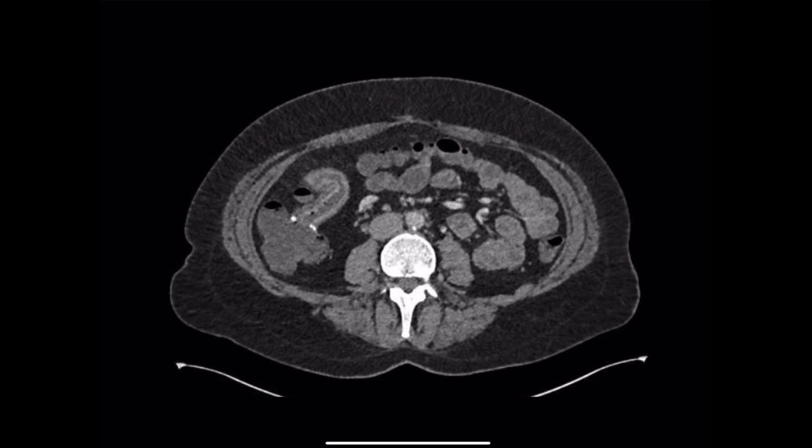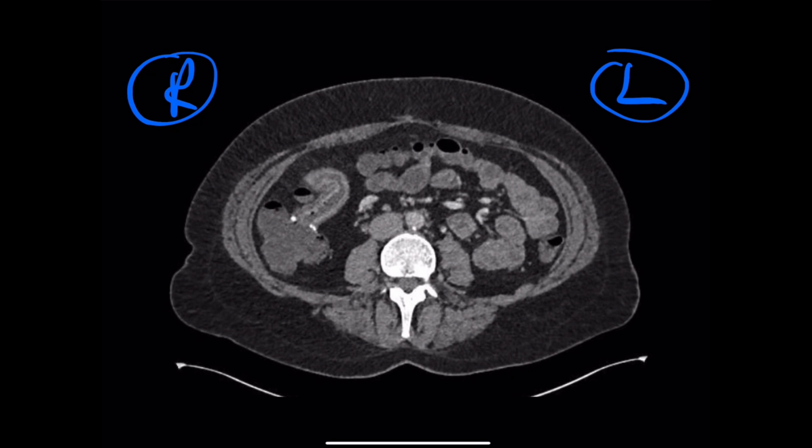So in this particular lady, we've done a CT scan, and it's an axial scan. Again, the left and the right side of the patient, we are looking up from their bottom end, and spine at the back. And most of these are just ordinary small bowel loops. And they've been filled. For this particular type of scan, we have asked the patient to drink loads of water, and it's filled up the small bowel. And what it has done in this particular image is highlight an abnormality.